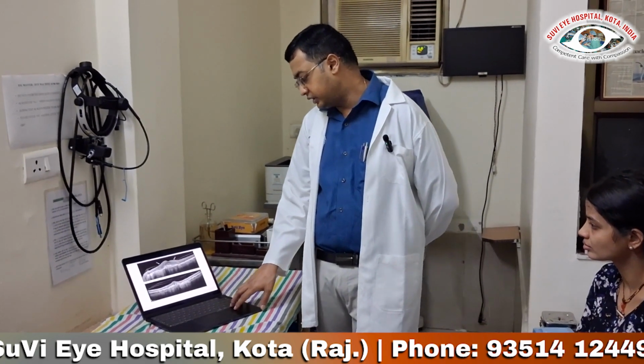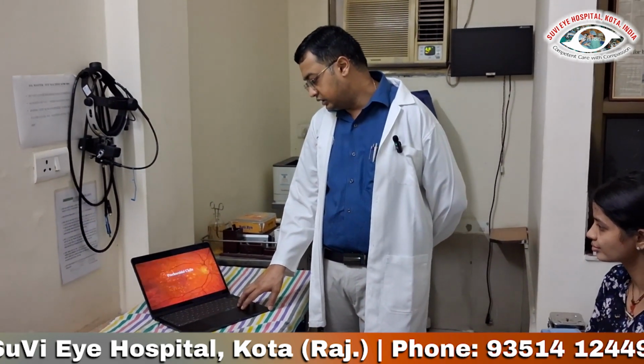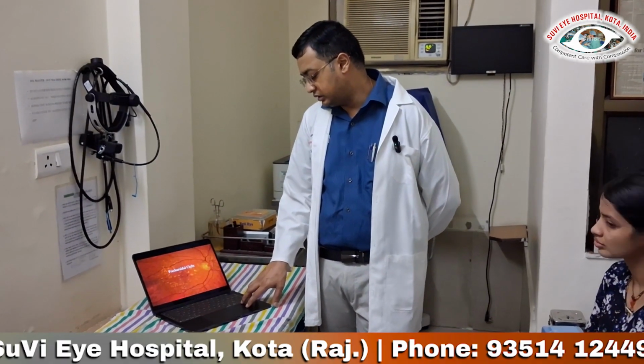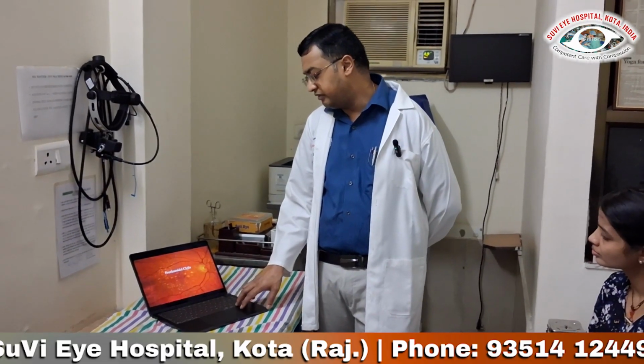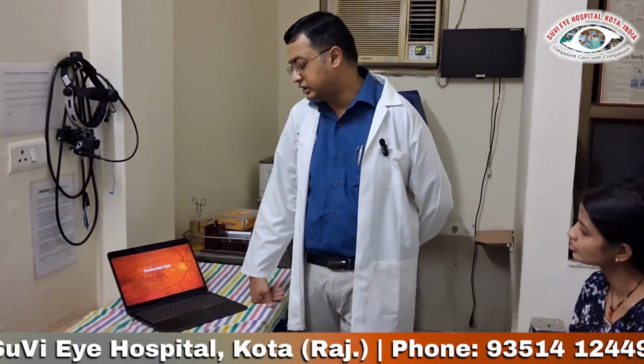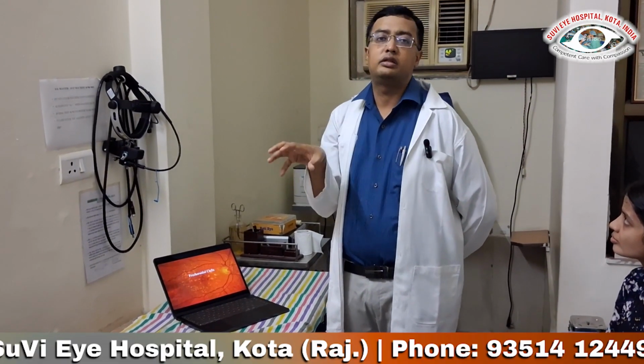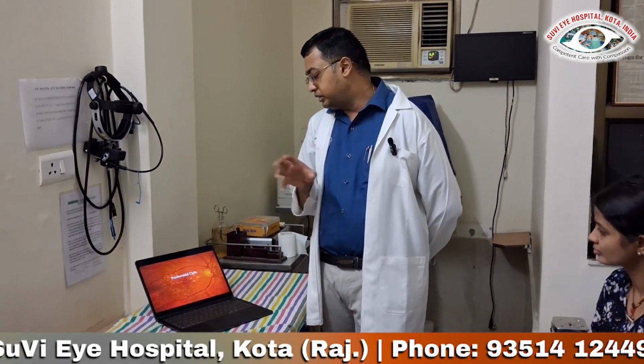Vitreomacular alterations. Okay. Coming to the choroidal biomarkers, they have prechoroidal clefts and choroidal cysts. Prechoroidal clefts, I was studying. Anyone, what are prechoroidal clefts? These are hyporeflective spaces between the RPE and the Bruch's membrane, the sub-RPE space, which are more common in type 1 and type 3 CNVM, less common in type 2 CNVM. It indicates a poor prognosis only.